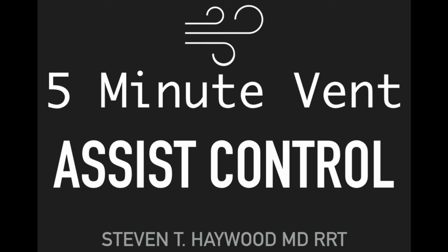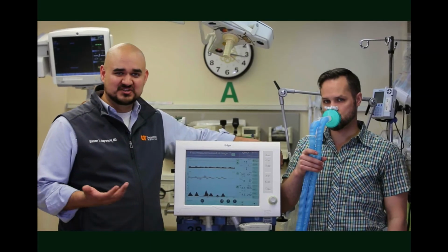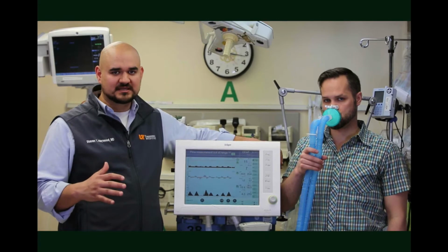We're going to take about 5 minutes and talk about assist control mode of ventilation. It's often abbreviated as AC. This vent actually calls it CMV, which is technically an outdated term, but it's all talking about the same thing.